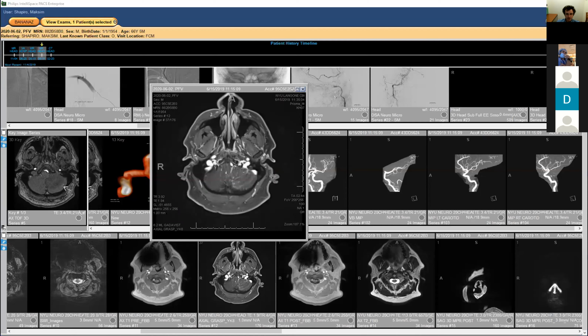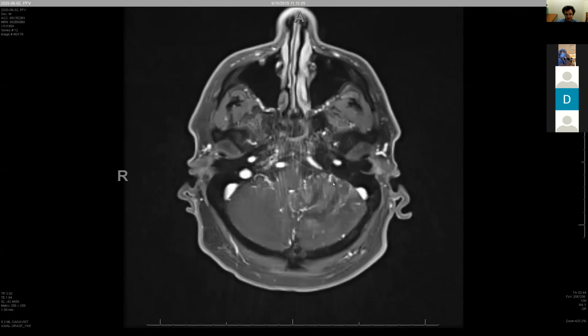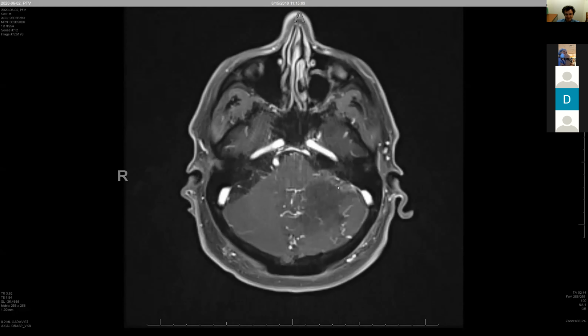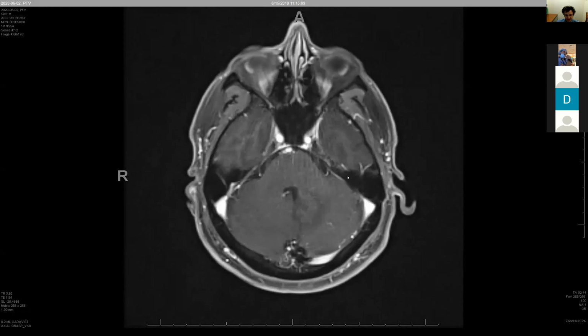Yes, I think so here. Ultimately, it doesn't have good outflow. The problem is that it kind of goes to where the petrous angle would be, but I'm not really sure how directly it's connected. Kind of a dynamic picture.